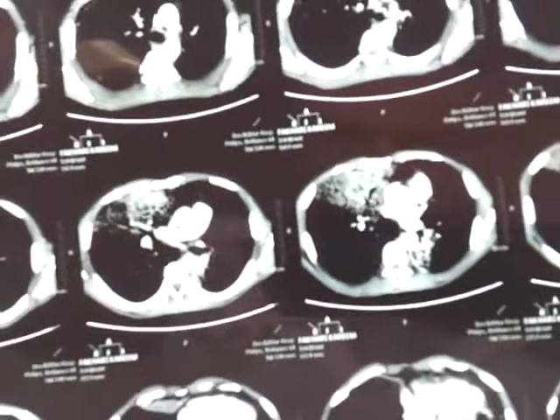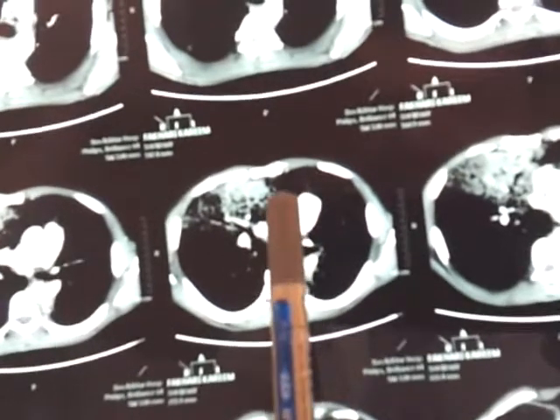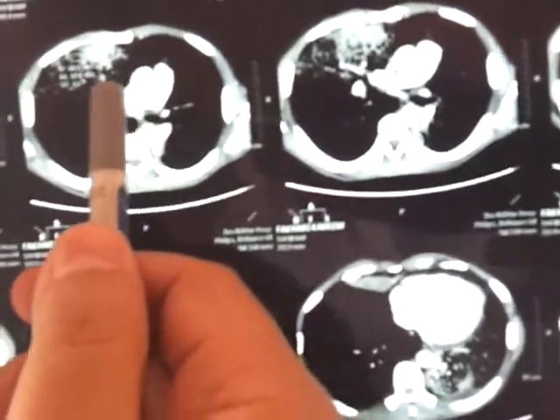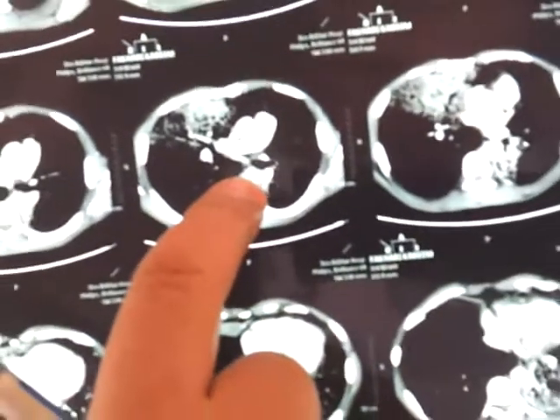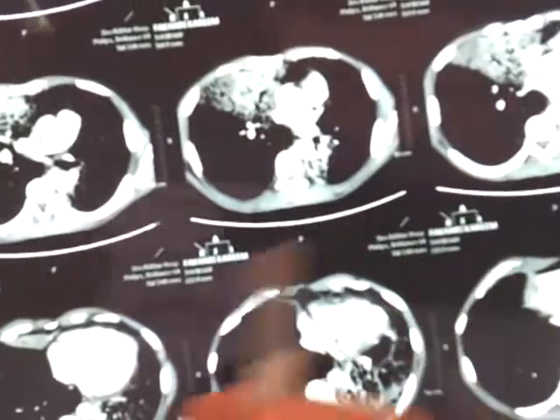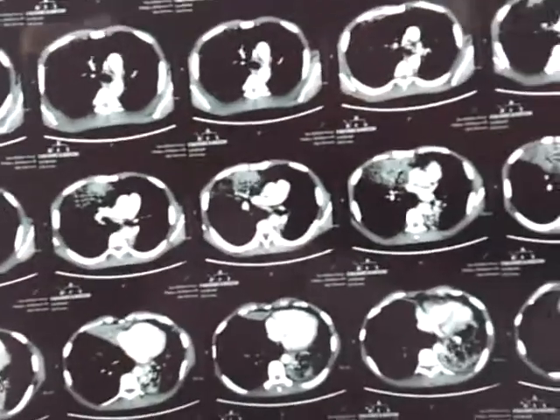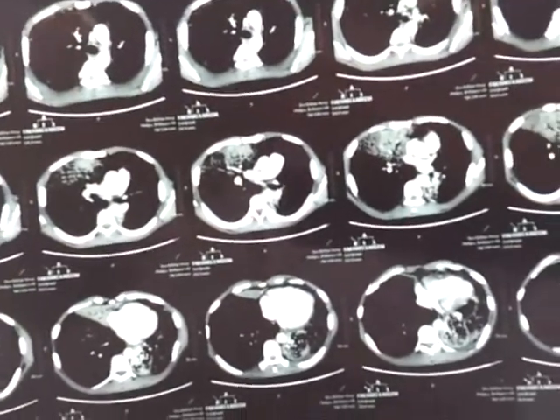What could be the type of pneumonia this is? You see, this is the pulmonary artery, this is the aorta, this rounded one is the aorta, this is the pulmonary artery, just cuddling the aorta. Cuddling means يحضن. This is the aorta, this is the thoracic aorta also, and this is the pneumonia. This is a pneumonia with air bronchogram. What could this pneumonia be? Bilateral pneumonia, bilateral lobe pneumonia. What is the cause of this pneumonia in this chronic bronchitic patient?